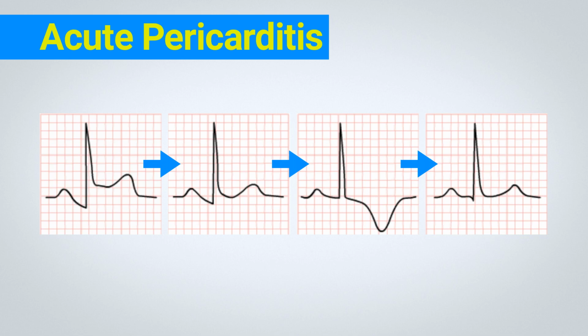The resemblance between the ECG patterns of acute pericarditis and acute MI, especially with both conditions possibly leading to ST segment elevations followed by T-wave inversions, warrants emphasis. It's worth noting, though, that pericarditis-induced STT changes are usually more diffuse compared to the localized changes associated with MI.